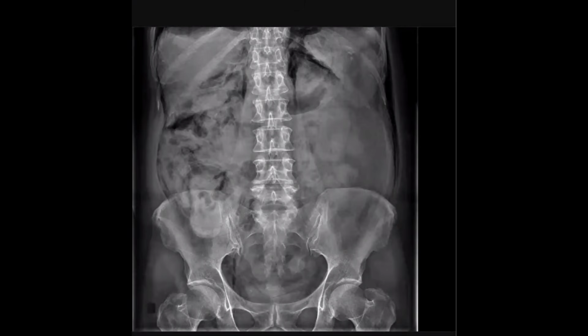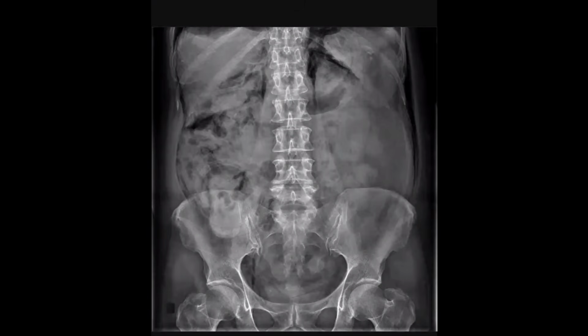Candidate number 4. Yes, sir. Can you please describe? Okay. Yes, sir. This is a frontal radiograph of the abdomen in which I can appreciate that there is air outlining the lateral margin of left psoas muscle and the renal margin and upper pole. I can also appreciate a similar air lucency noted along the lateral border of the right psoas muscle as well.